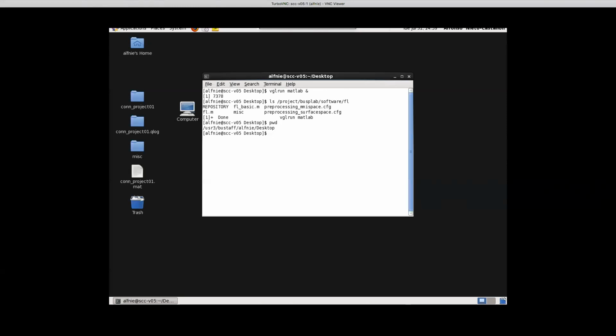So in that FS average space, would two different subjects have different placements of their gyri and sulci? They are meant to be the same. That's what FreeSurfer does. It tries to match the individual gyri and the sulci of every subject to the FS average representation of how the gyri and sulci should look if you look at the spherical representation of a standard brain.